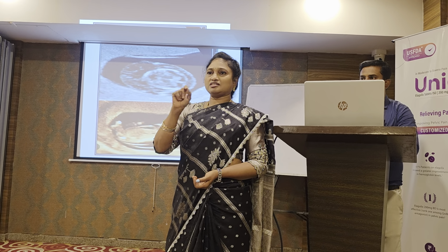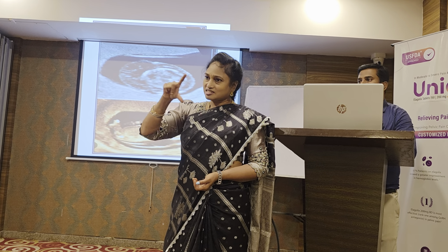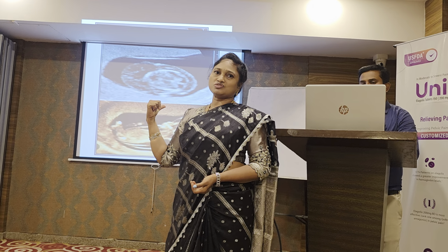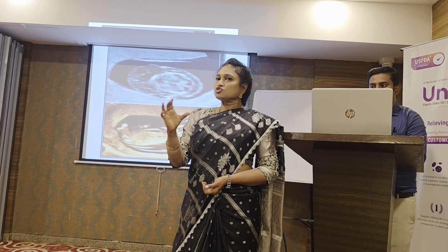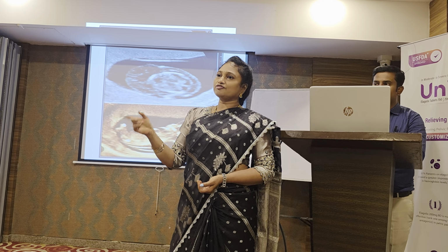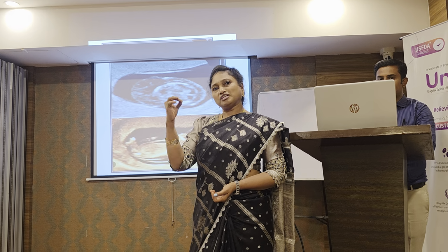11 to 14 weeks, that is when the CRL is between 45 to 84 mm. That is the right time to pick up this nuchal translucency, because later on it shrinks and comes back to normal. So if the patient has come in the 4th or 5th month, we will easily miss this anomaly. That's why get the markers done whenever the patient comes.